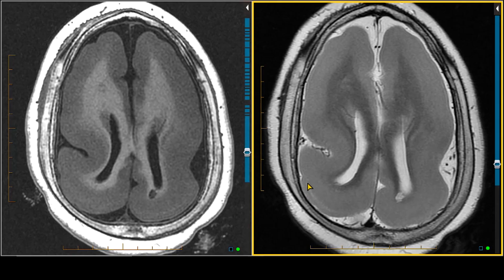These little areas where it looks slightly bright is actually white matter. It is what's called the cell sparse zone. And then beneath that is an additional band of gray matter. That band of gray matter follows the surface of the brain throughout both cerebral hemispheres. This deeper gray matter that's in a band-like configuration is not in the normal location, so it's called heterotopic gray matter. This pattern of heterotopic gray matter is called band heterotopia.